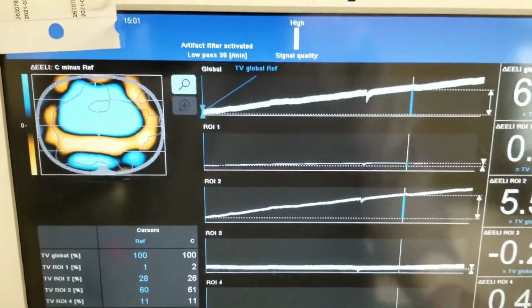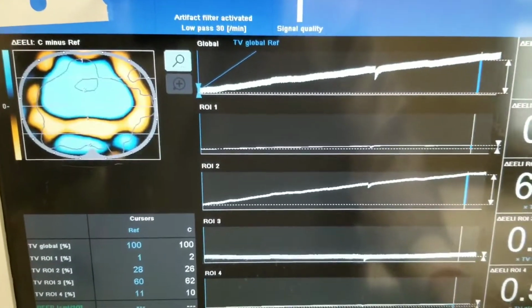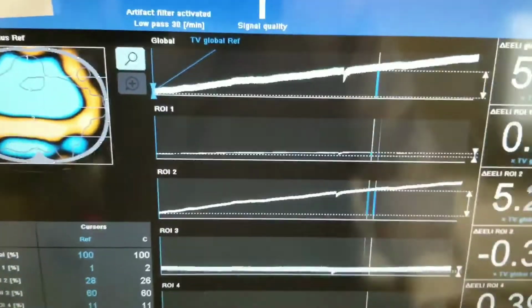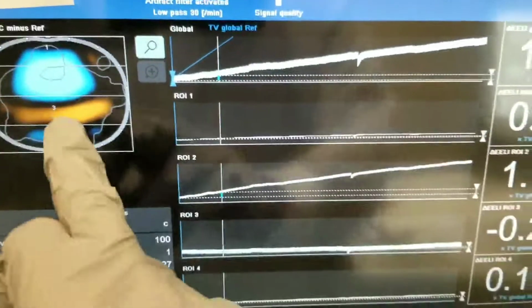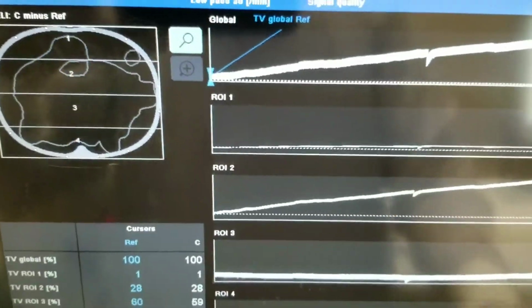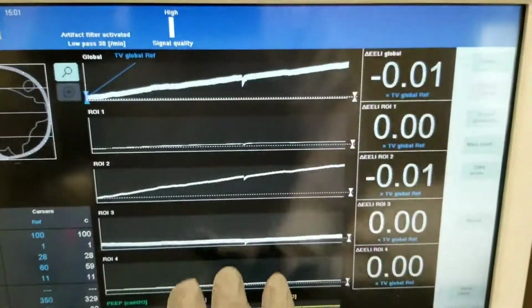Okay, we'll go quickly because I just wanted to show you the picture. Now it looks like the picture is not moving if I'm scrolling this way, see? Not much change has occurred, at least in the visual aspect. So this is where you can see quickly the trend.